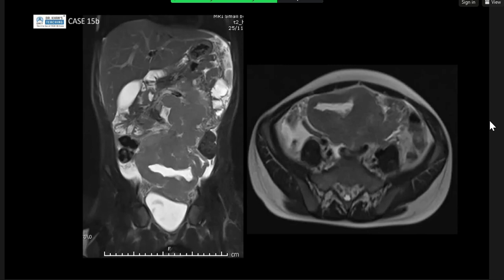So I'm thinking of aneurysmal dilatation with multiple conglomerate lymph nodes, likely lymphoma. The other less likely differential will be a GIST with central necrosis.